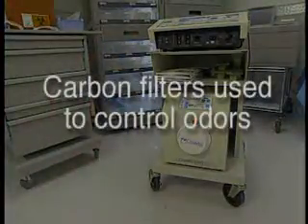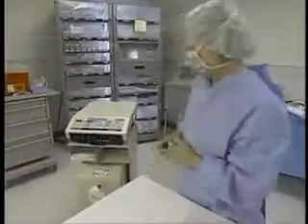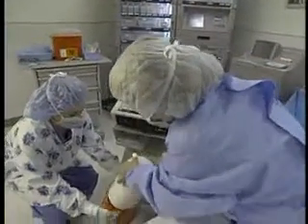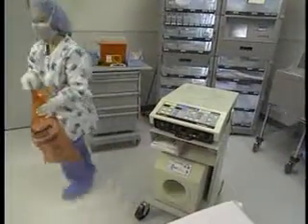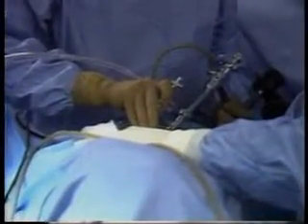Patients should also be protected from possible smoke inhalation. The production of smoke within the closed space of a cavity can be hazardous to patients. Studies show that patients demonstrate changes in normal hemoglobin due to cavity smoke absorption. Fires can cause considerable harm to patients and personnel. Fire prevention is a major priority.